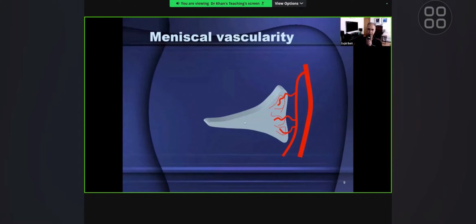The meniscus is normally low signal intensity, and whenever they see an increased signal intensity, relatively inexperienced radiologists tend to begin to think about degenerative change or a possible meniscal tear. But remember, in the young patients in particular, you will come across some increased signal intensity in the meniscal tissue, which is because of normal vascularity.